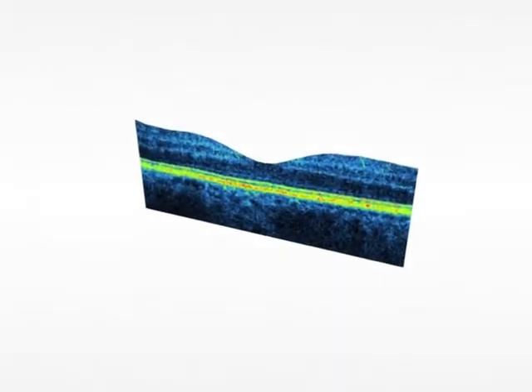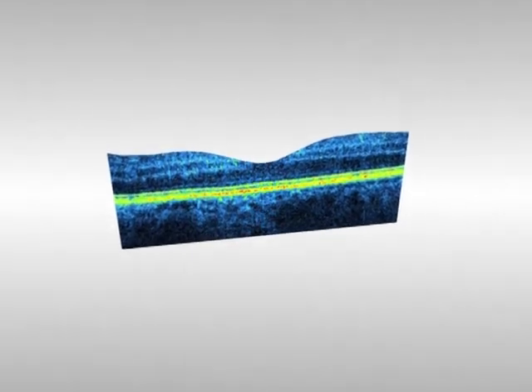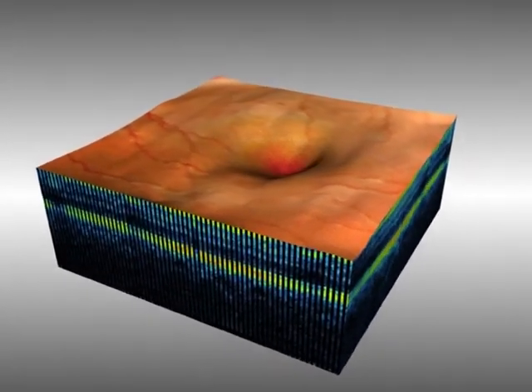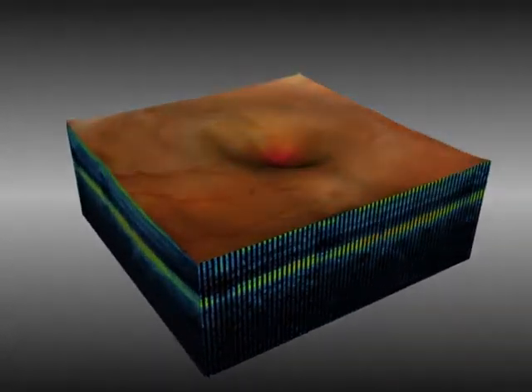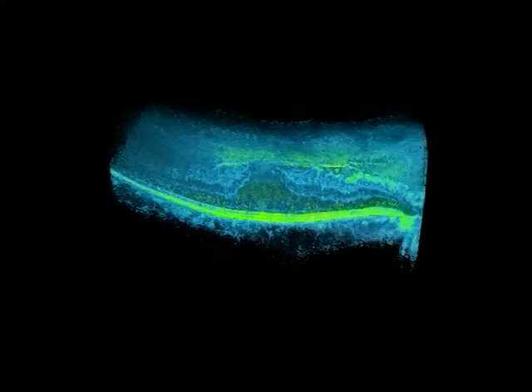Spectral domain OCT gives us new possibilities to describe and observe the disease. Thanks to the great number of B scans achieved on the surface of the retina, we can create an artificial image of the retina. Three-dimensional images of the pathology are also available.